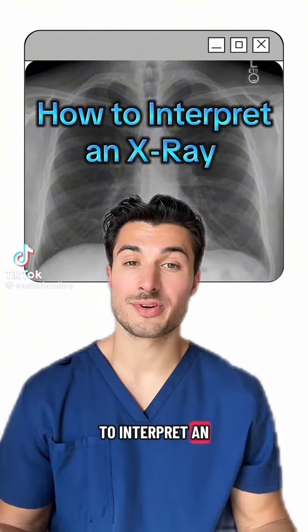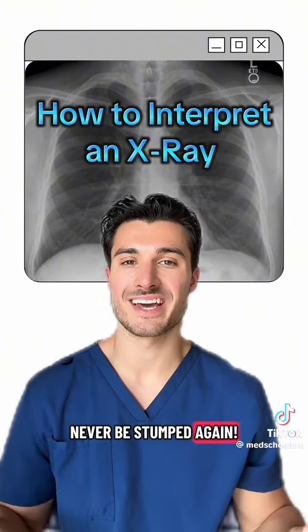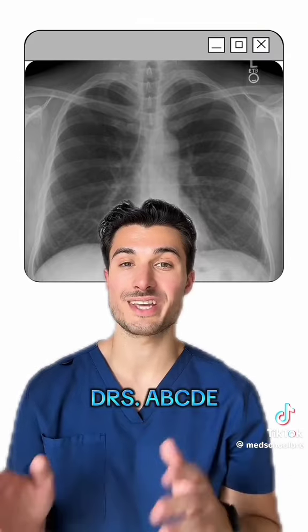Ever been asked to interpret an x-ray and you don't know where to start? Well, follow this simple approach and never be stumped again. It's a really simple mnemonic, Doctors ABCDE.